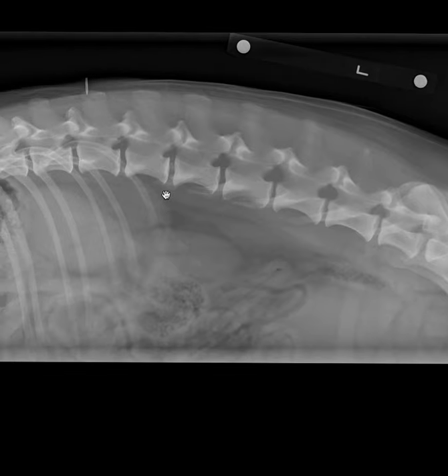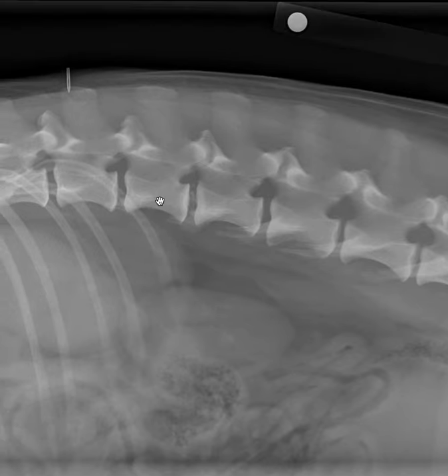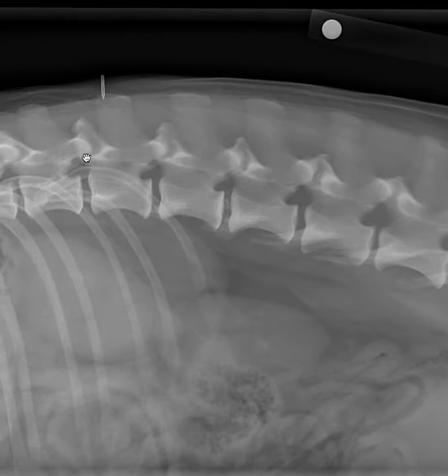After alignment, I then move in to assess bone and cartilage. For spine, I employ a specific sort of subroutine where I look at bone and cartilage almost together, because what I essentially do, and I'm going to zoom in for this again, is I try to look at key features of each vertebra within itself and relative to its neighbor the whole way along the spine.